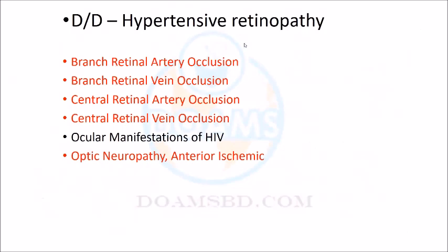Now, if this is the hypertensive retina, this appearance may be confused with other diagnoses as there is bleeding. Retinal artery occlusion, you have seen that. Retinal venous occlusion, which is more likely to be confused, the artery or the vein? What do you think? It's a vein occlusion, rather the veins.